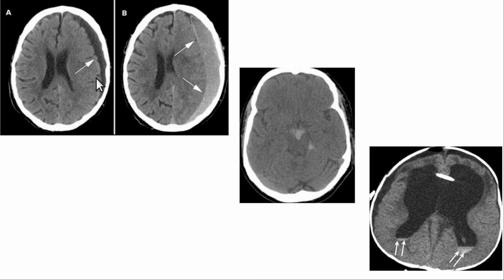So anyways, here's also midline shift with this one. It's a milder midline shift, meaning we might not take this patient to the operating room. Here's the interpeduncular cistern in the midbrain, and this material here is too dense. So this is a bleed.